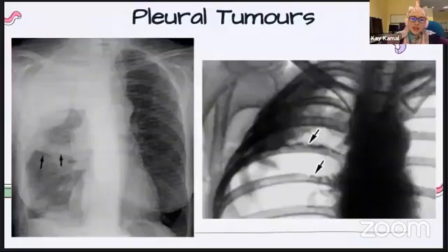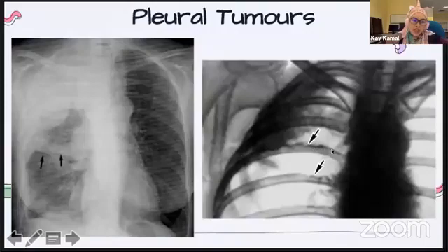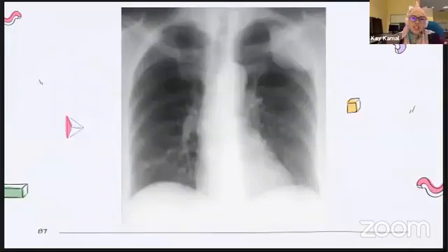And this is pleural tumors, just to show you, there's a malignant pleural tumor here. In this case, this is a malignant mesothelioma, which causes the rib erosions as well because of the pressure erosions. Sometimes it eats into it. And this one is a pleural fibroma, in which 1/3 of it is malignant. Like I mentioned just now about obtuse angle, this is an obtuse angle. You can see the angle is big. If it's from the lung, maybe it will be round like this, then it will have some acute angle.